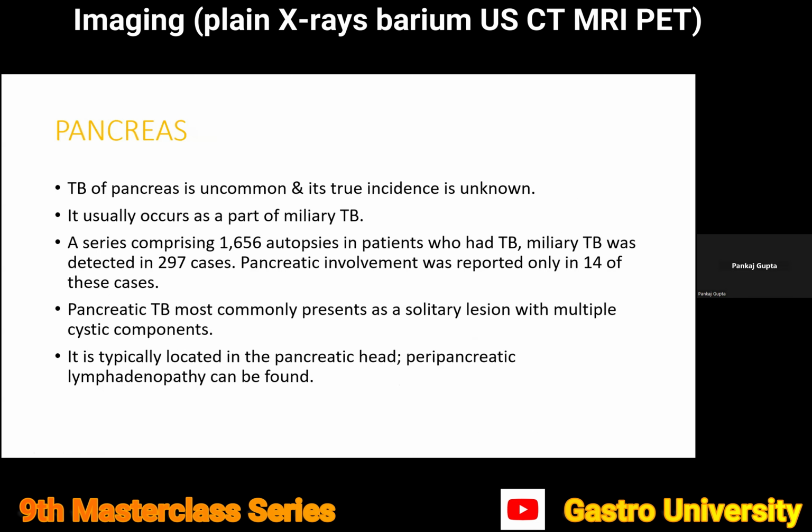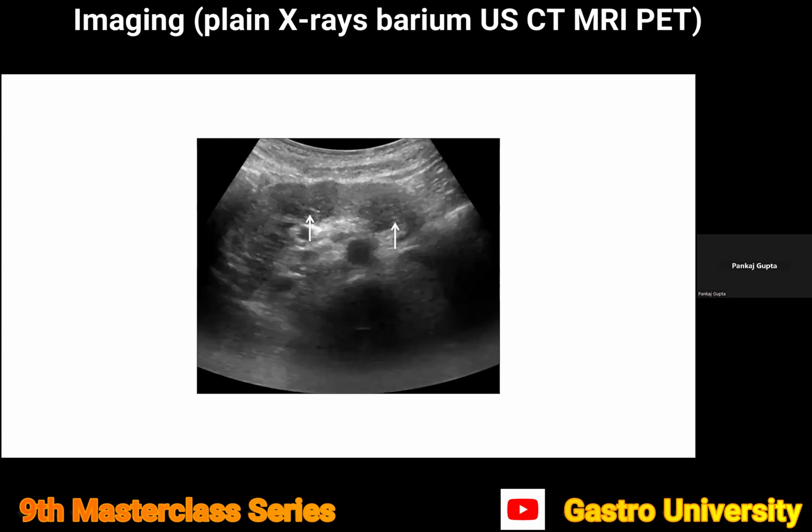Pancreatic TB again is rare. The previous speakers have shown some examples. I'll be adding to it. As has been told previously, most commonly the head of the pancreas is involved. In fact, some of the investigators try to club the peripancreatic lymph nodes together with pancreas to call it pancreatic TB. It is a bit debatable.